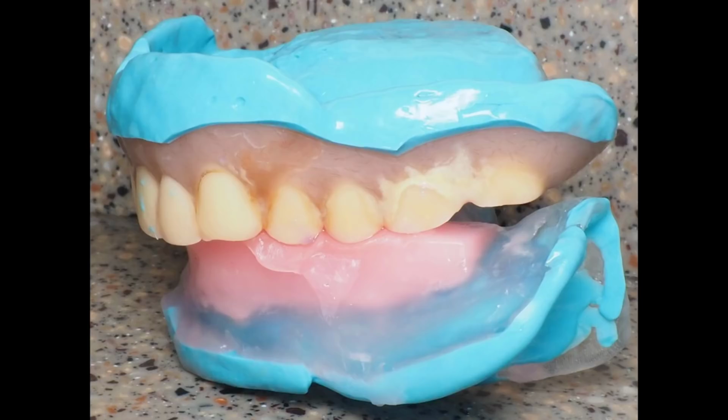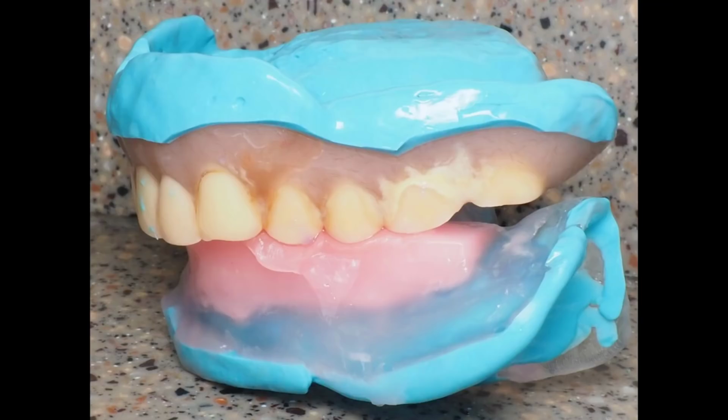So this is all the information that we need, along with some pictures. If you jump back to here, you can see this patient's existing dentition. If you were to look at his lip at rest, he essentially didn't show any of his upper teeth, so in my mind we needed to add a couple of millimeters of length to the incisors. And so that's where we're at in this case.